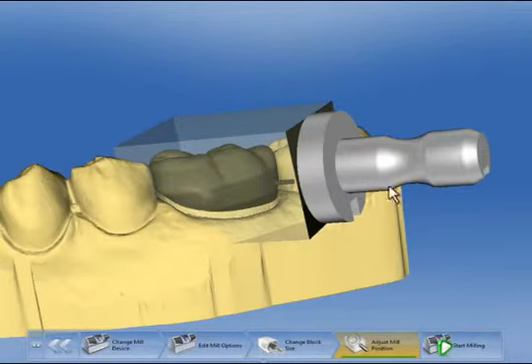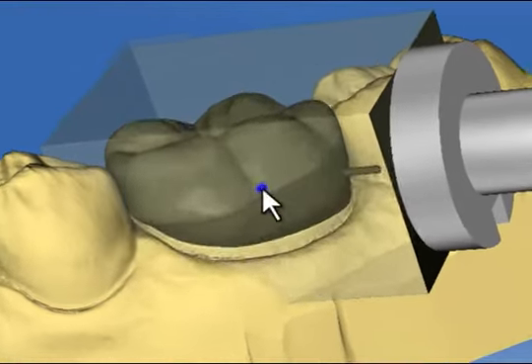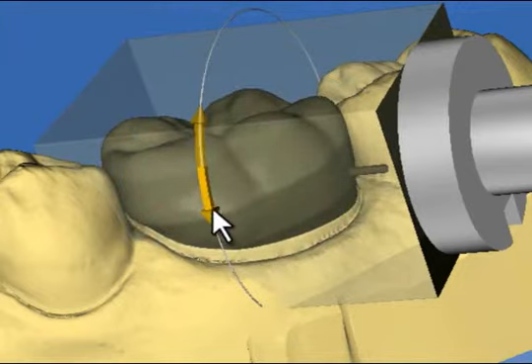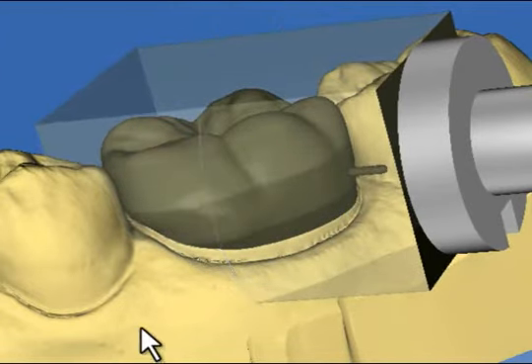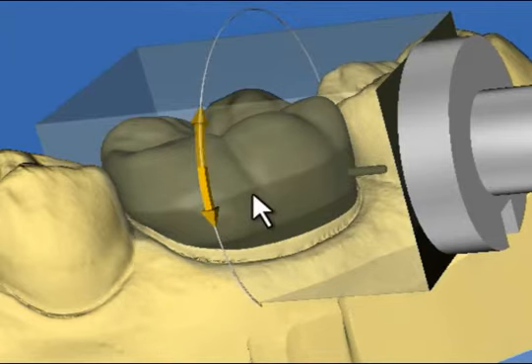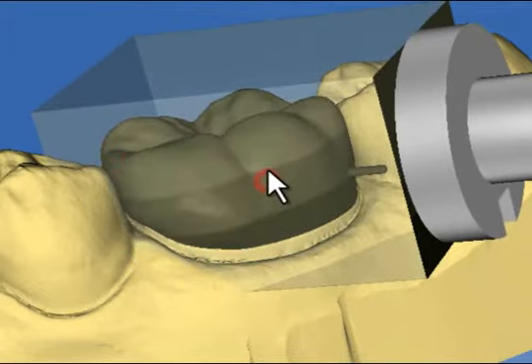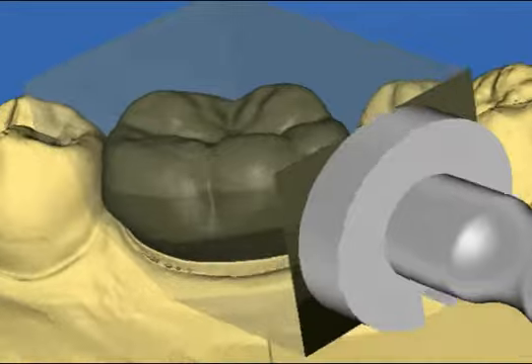We now superimpose the jaw model to better assess the color gradient. We also have a tool wheel and can rotate the restoration in the block. A right mouse click opens the tool wheel again, and we drag the block until the color gradient meets our own particular preference.